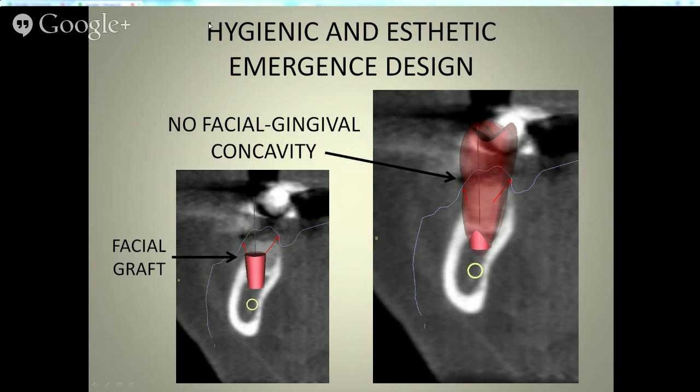We design the nerve in the software, and typically when I get online with a doctor, we'll go over where the nerve is, and I'll show him how I did it, and he'll either approve it or ask me to move it here or there. The biggest question a lot of times is the anterior loop. Where does that go? But there's pretty much a 5 millimeter parameter for that. If we stay 5 millimeters anterior to it, we're usually okay. But a radiographic reading is available. It's not part of the software. It has to be looked at in the software by an oral radiologist.